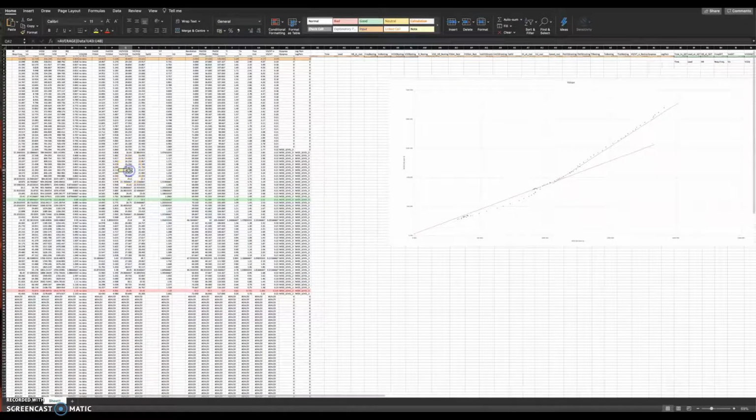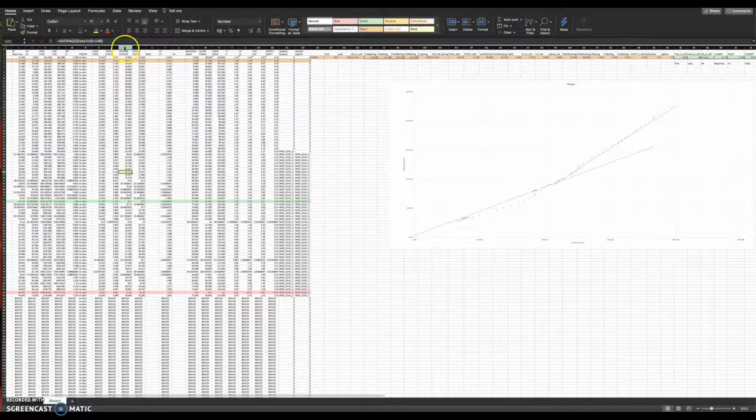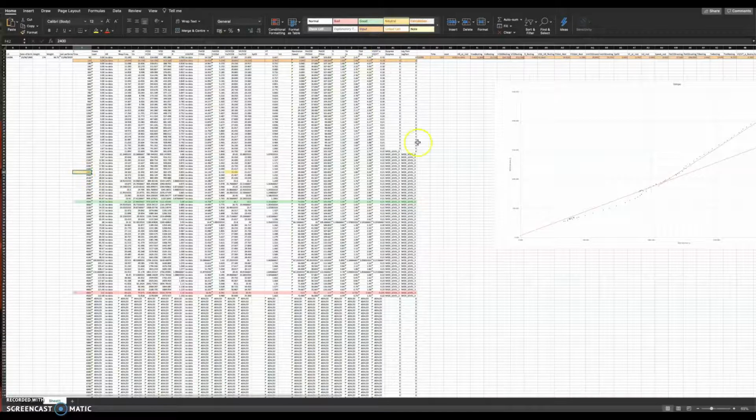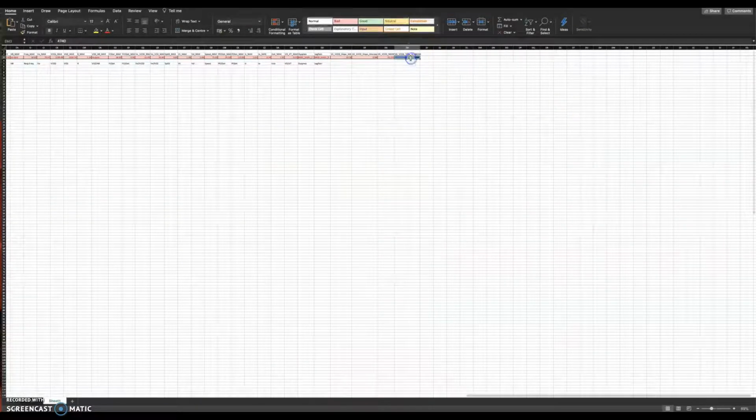So this is the nadir here. It's the lowest point, if you like the point of most efficient ventilation, and it generally corresponds to this, but I found that it isn't really. So that's the last thing you do. Basically you're just telling it to look at all these points only up to there, and then take out the minimum point, and it highlights the minimum point. And then the last thing you have to do is look across here for the time that happens, highlight that neutral, and then just 2400, stick that in there.